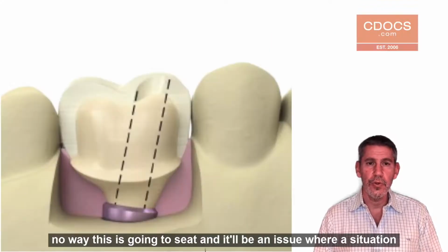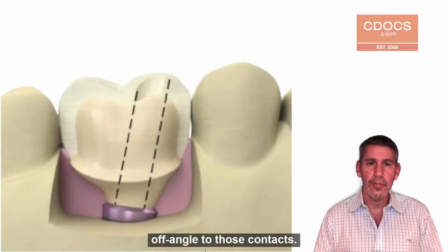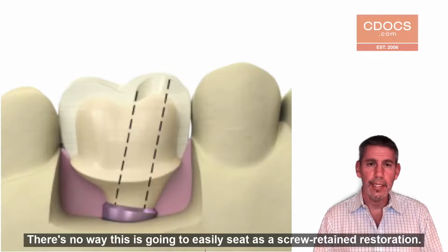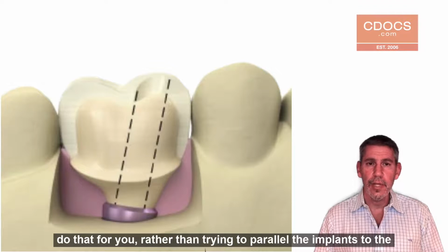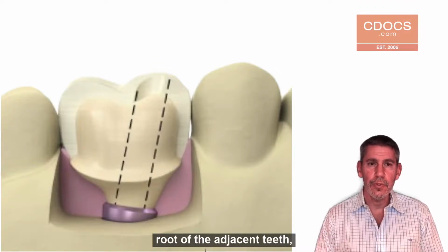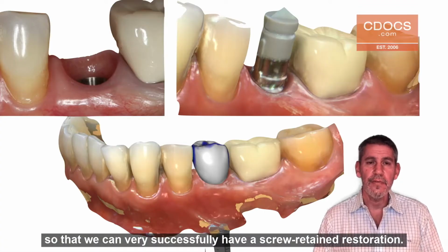It'll be an issue in a situation like this, where the implant is positioned at an off angle to those contacts; there's no way that this is going to easily seat as a screw-retained restoration. So whether you're placing the implant yourself or you're having somebody do that for you, rather than trying to parallel the implants to the root of the adjacent teeth, we want to make sure that we parallel the implants to those contacts so that we can very successfully have a screw-retained restoration.